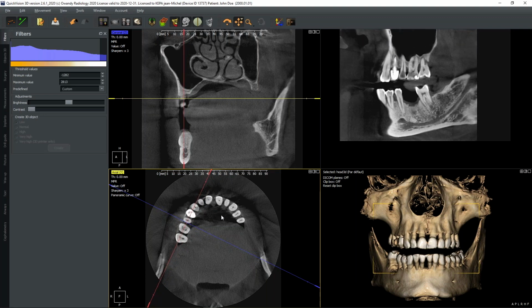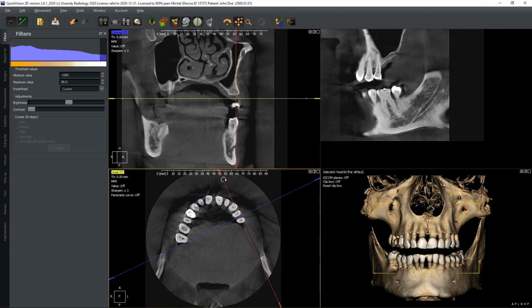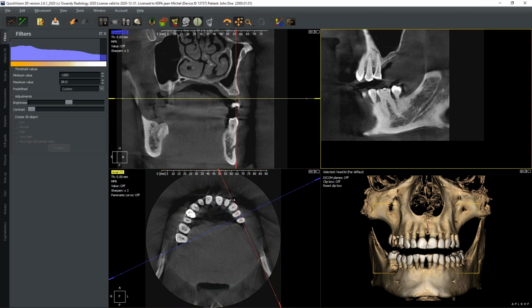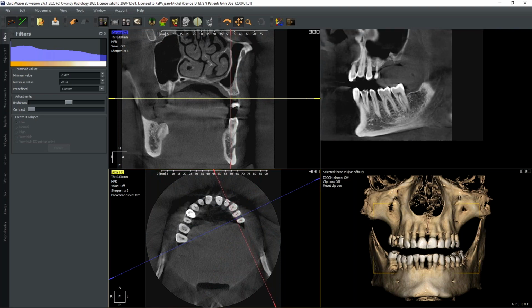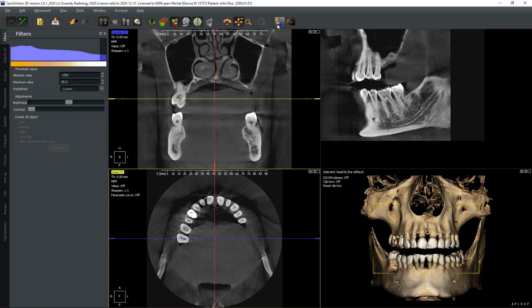I check one side. Then I go on the opposite side. I also align to the bone, and we also move left and right in a way to check inside my patient. You may see something, the bone is very thin on that area here, an example. Okay, it was the second step. Now we are going to see the third step.